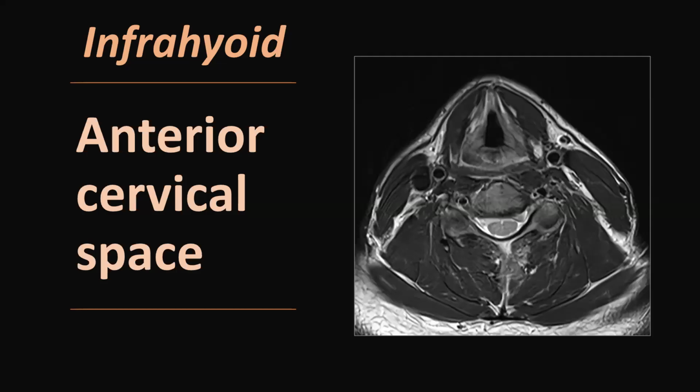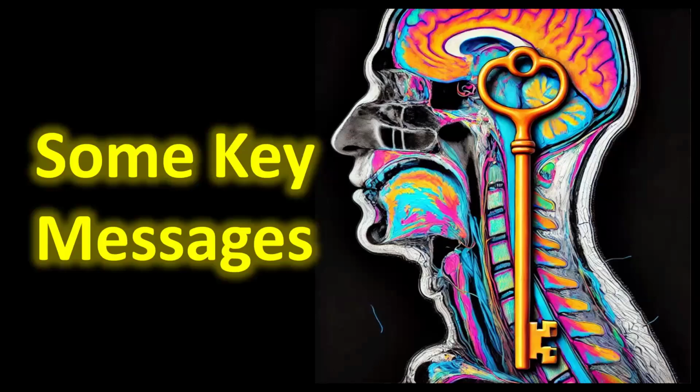In the anterior cervical space, well, we only have fat, so basically pathology in this space is mostly extension from pathological entities in the surrounding spaces. So it's just a very small fat-containing space in the infrahyoid compartment.